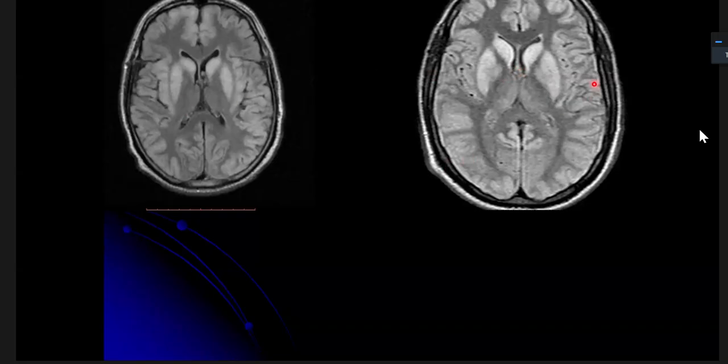In adults, the thalami are resistant to hypoglycemic insult. So when you see deep gray nuclei involvement with involvement of the thalamus and posterior occipital lobes, it indicates HIE. The presence of thalamic involvement almost always rules out hypoglycemic encephalopathy in adults.